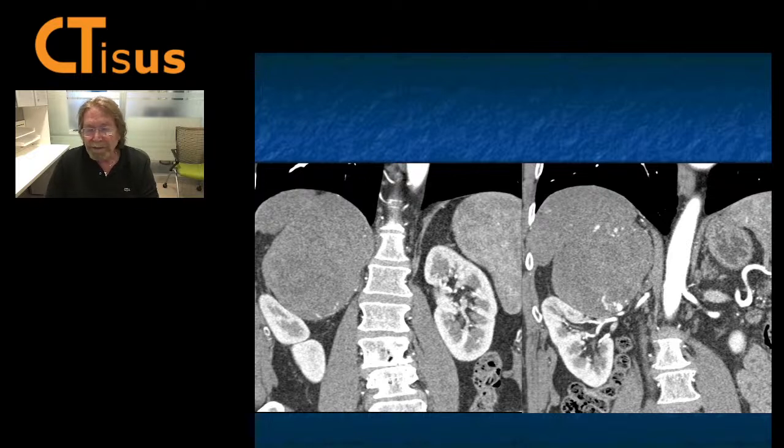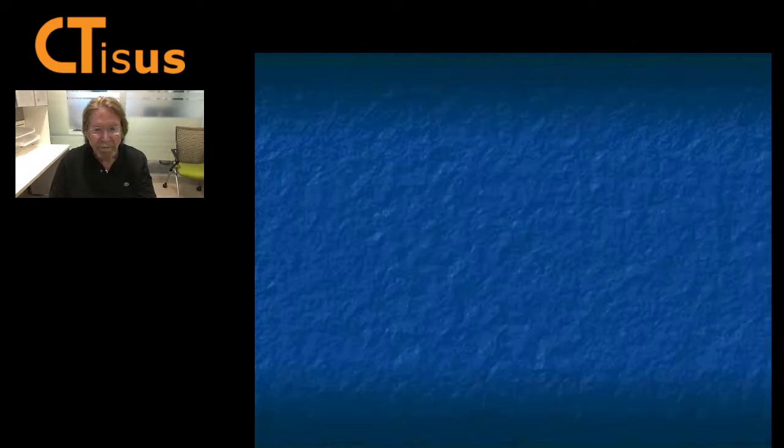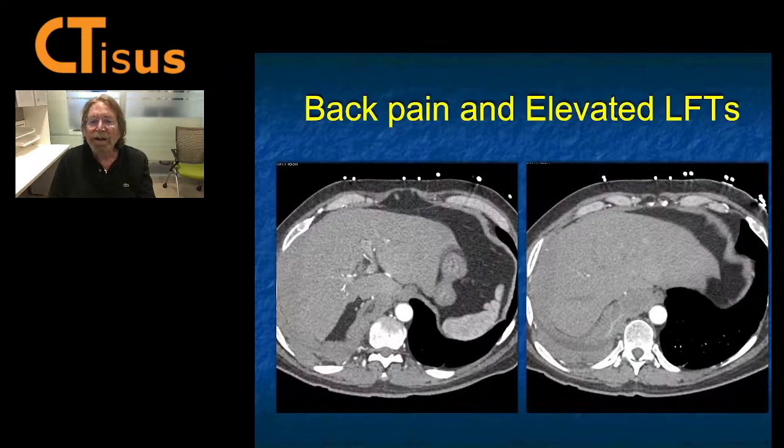I worried about malignancy, and ACC was a big concern. This was resected. You know what this was? And this is what keeps all of us honest every day. It was an adrenal cortical adenoma. Adenomas, we think of under 4 cm, low density, washout. We think of all those things. But adenomas can be very large. They can be solid and have vascularity. What a wonderful example. And this patient was very lucky. Imagine going to surgery thinking you had a carcinoma and end up with an adenoma. You're cured.